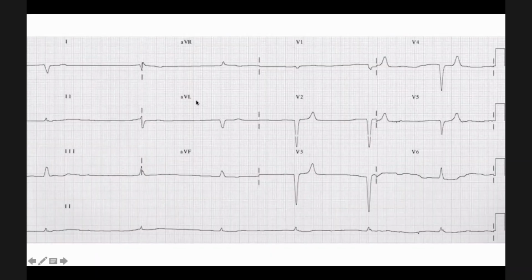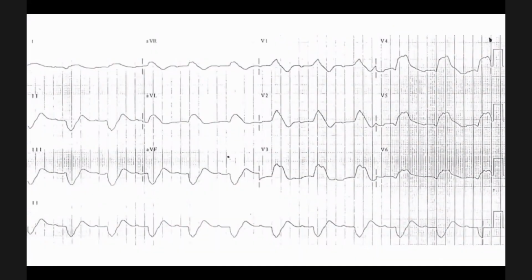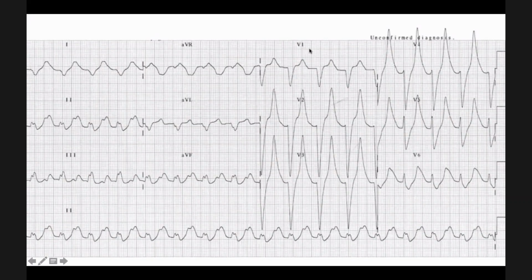Here you can see significant bradycardia and also the tall T waves as well. You can see the P waves are getting flattened. This is again an ECG with hyperkalemia. And you can see again the broad QRS, again the very tall T waves, and also this is of course called a sine wave, and this has somewhat tented T waves.